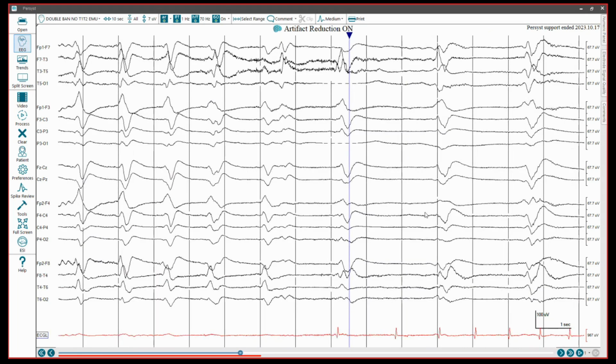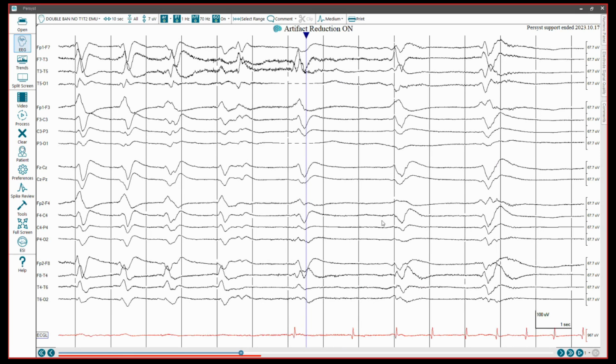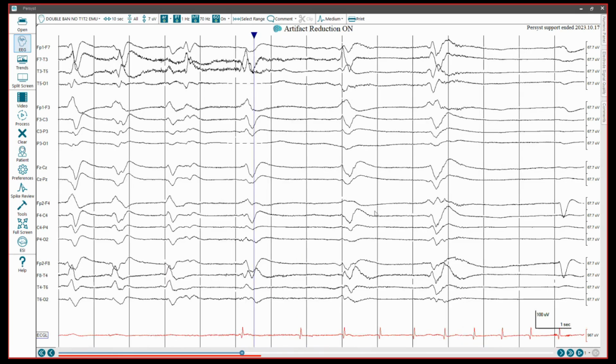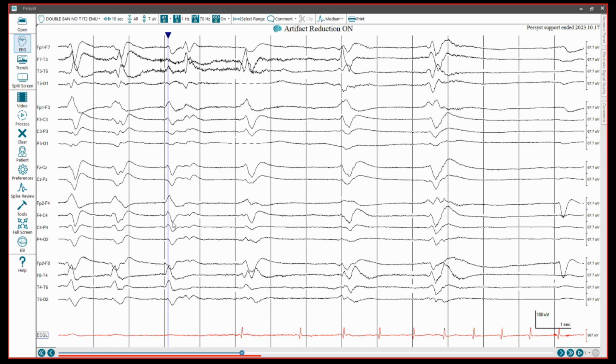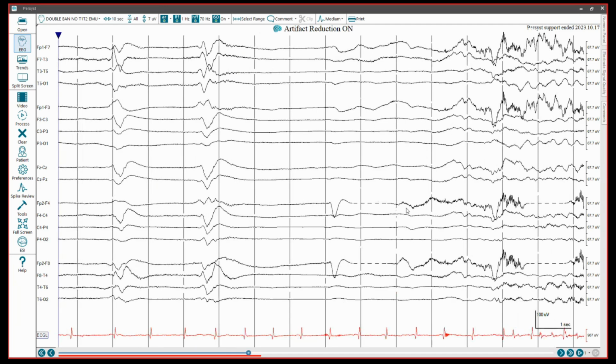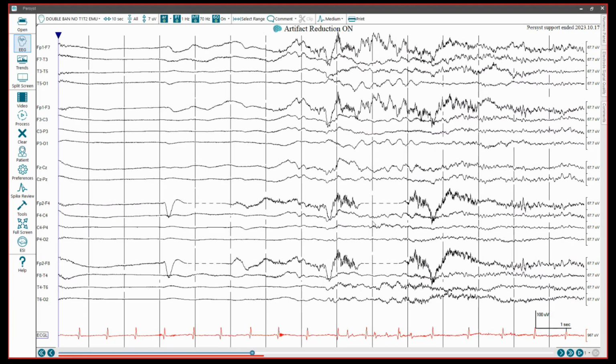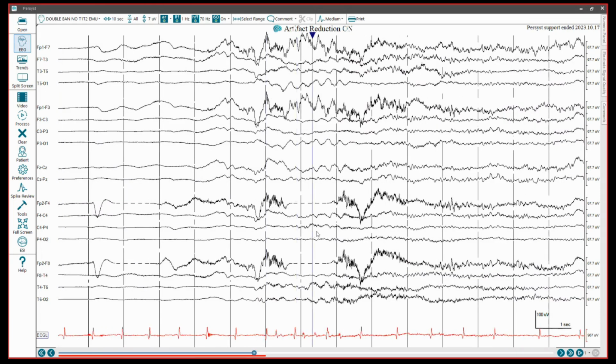That we have maybe 5 seconds of generalized suppression. And we can see around here, since the heart rate has been restored, it is self-corrected, it's come back online. We can see some of the brain waves coming back. We can see that some theta is coming back, and then the faster frequencies start to represent. And this is a little complicated because how much blame do you assign to the seizure itself, and how much blame do you assign to the heart not pumping? So it's likely a combination of those two.